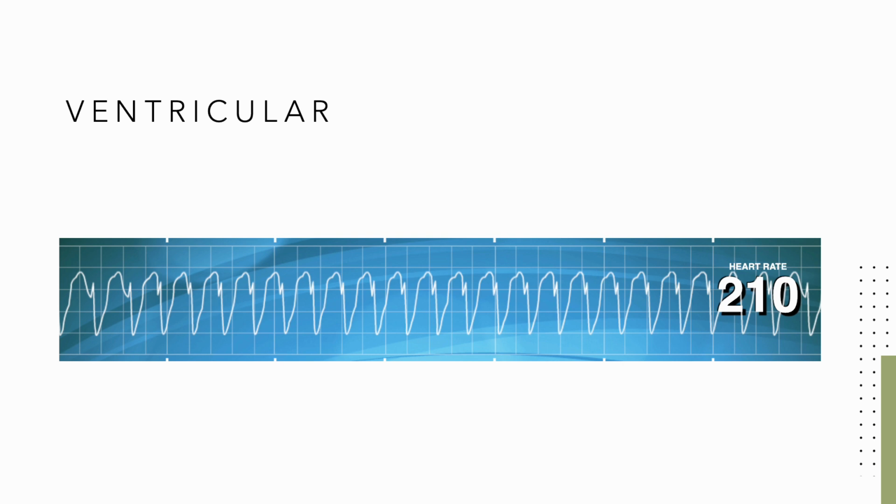Remember, our T wave is where repolarization is happening. We should not be having depolarization during repolarization. Duh. This specific rhythm is called monomorphic VTach. It is monomorphic because the morphology is the same every time. This is in contrast to polymorphic VTach, which has different morphology each beat.